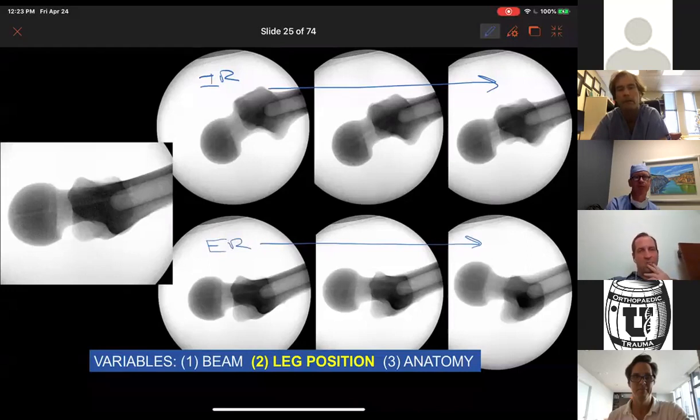And so you'll see the relationship of the greater trochanter is necessarily going to change, assuming it's intact, to the neck and the shaft. And you can see how it would be really easy, if you didn't standardize your lateral, to start at a point which was not in line with the neck and the shaft and in the central or reasonably central portion of the greater trochanter, right? So collinearity, useful standardization of a lateral x-ray. All right.